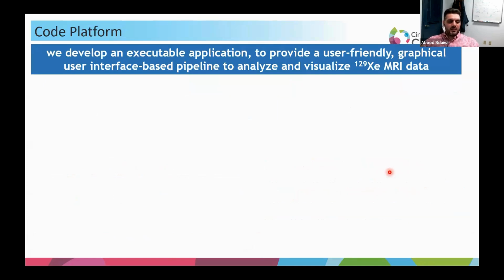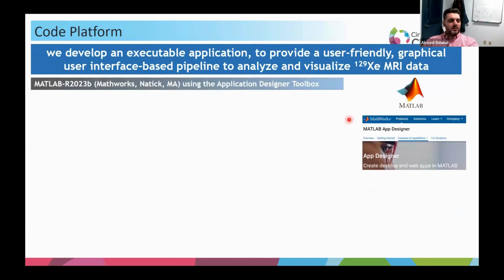And so here, the objective or the aim of this presentation is basically we developed an executable application to provide a user-friendly graphical user interface pipeline to analyze hyperpolarized xenon data.